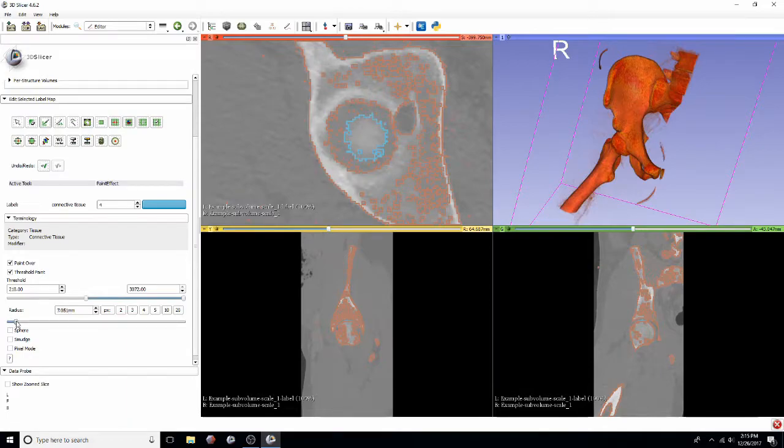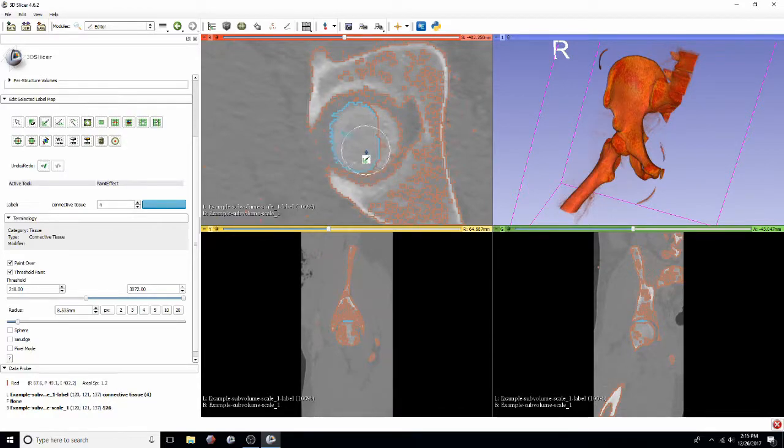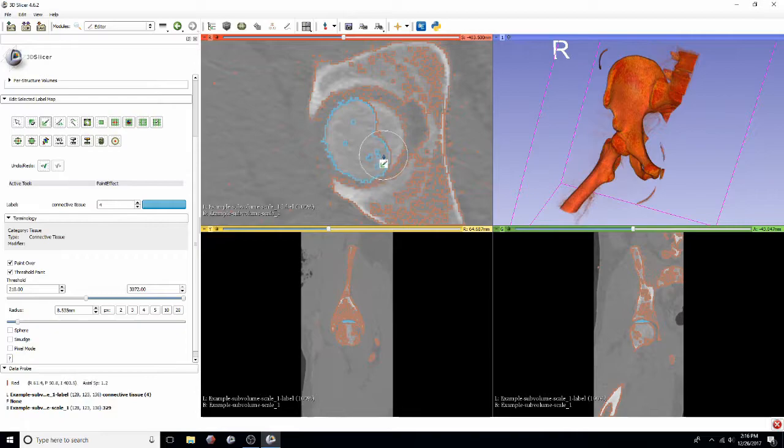So it's good to go through like this and manually segment out two anatomical structures that are really close to each other. As you'll see in a little bit, once we get away from where the acetabulum's just millimeters away from the femur, it'll become a much quicker process. But for right now, we want to make sure that we accurately do this.